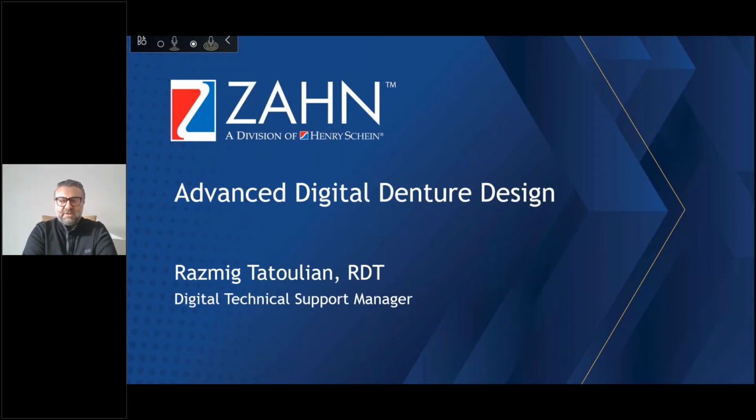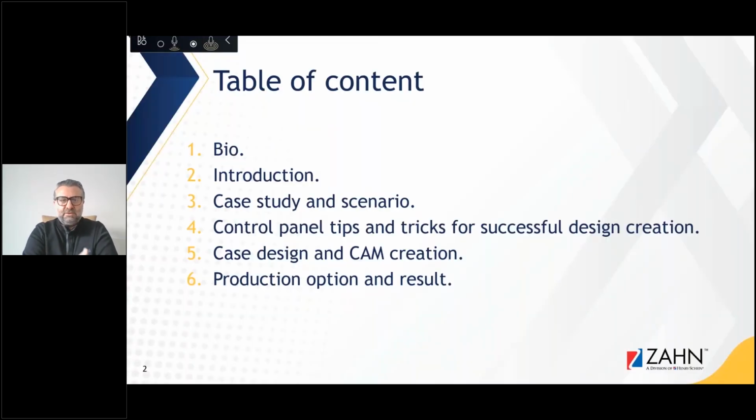And for this particular presentation, obviously, I have used our 3Shape Dental Systems software, along with a couple of other components of CAMs, as well as different materials. The idea behind this advanced digital denture design presentation is specifically to do an immediate denture on the partial end of it. So basically, a customer comes in with the need for a partial denture, and within the same day, there is the possibility of actually getting that partial denture done, whether from a printed approach or a milled approach.